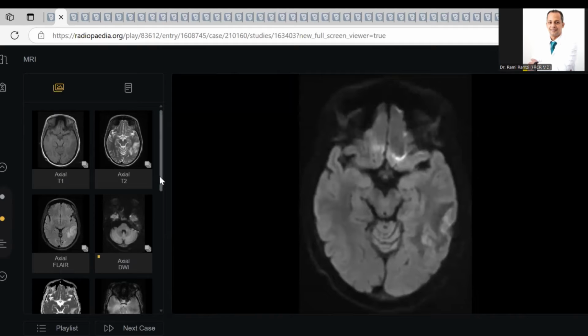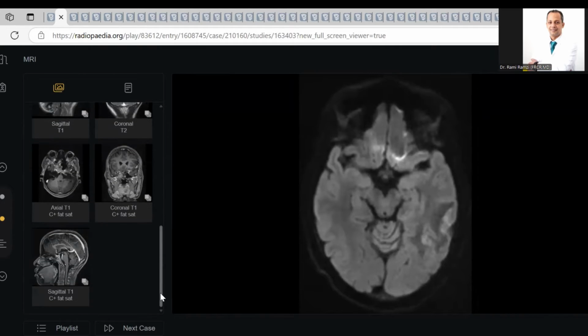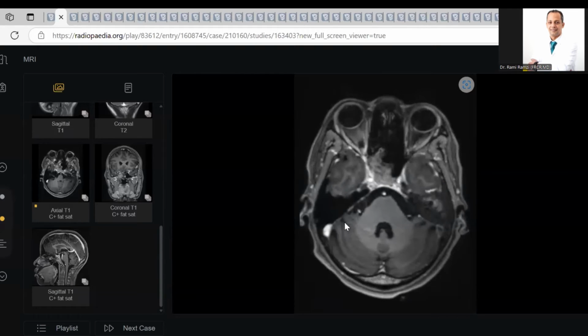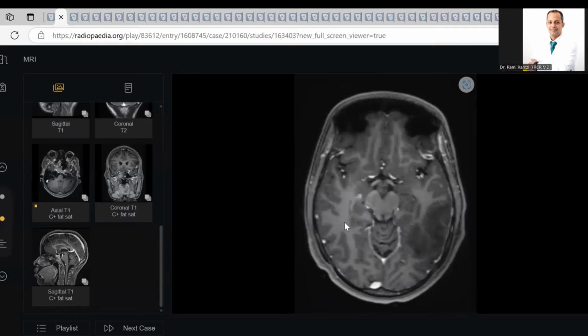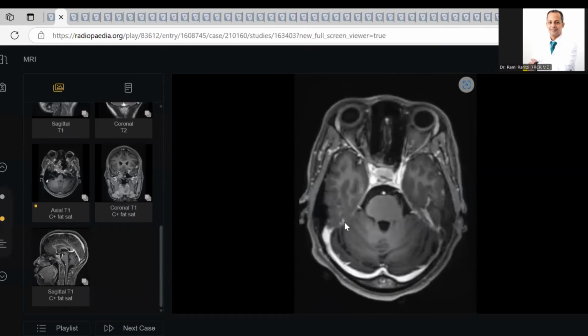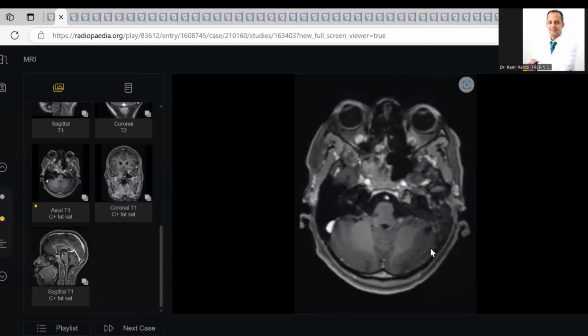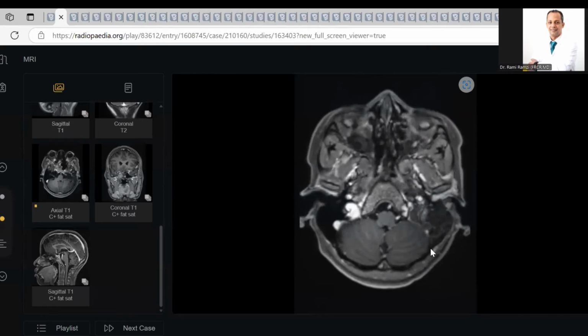And finally, here you didn't ask about the post contrast. If you didn't ask, the examiner will not give you anything. Ask please. If he refuses, okay, you at least make a trial. Here, compare. This is opacified. This is non-opacified. You pick up the thrombosis here well.